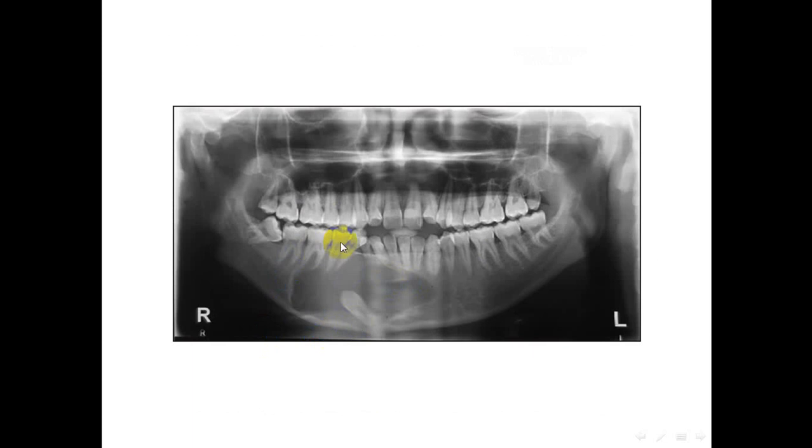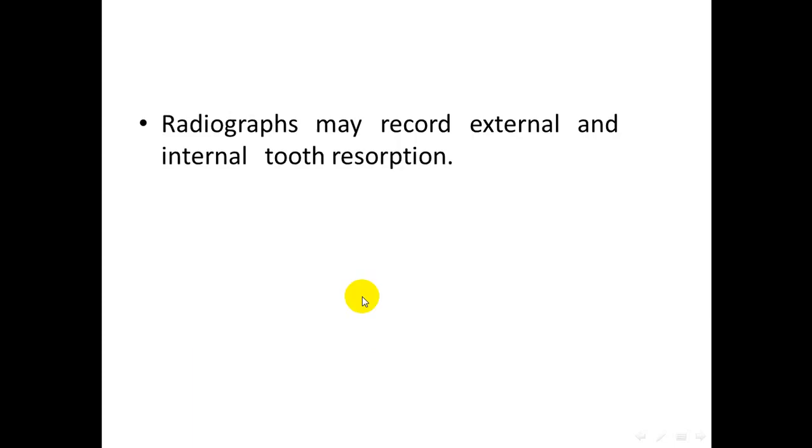This is another example of a dentigerous cyst, sorry, around the impacted lower canine. You see the huge resorption of the bone with force on the inferior nerve and forcing the canine to the lower border of the mandible.